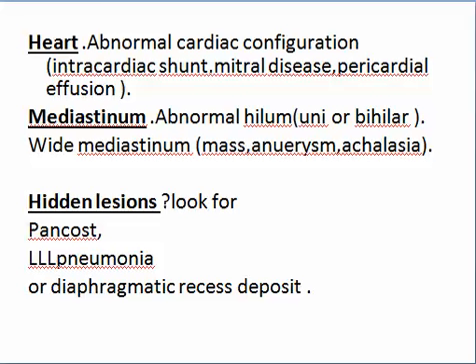Don't forget the hidden areas, like for example the apices, lower lobe pneumonias behind the cardiac shadow, or a diaphragmatic recess deposit covered by the hump of the diaphragm.